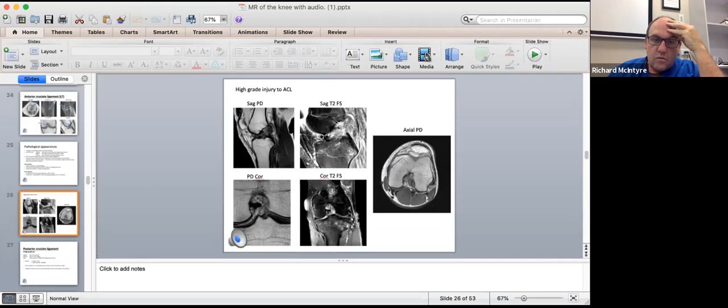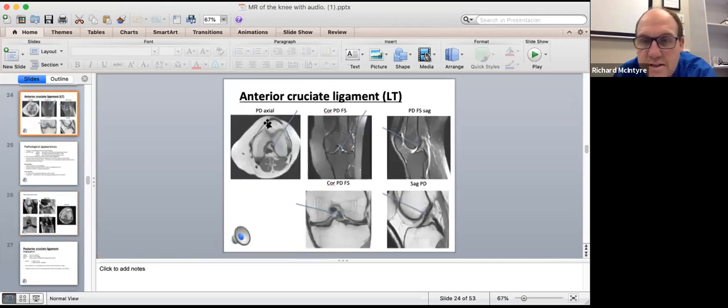We can see maybe proximal ACL, or the ACL attached on the tibial bone there, and it's hypo-intense. However, we lose that hypo-intense signal if we compare it to this one where we've got a hypo-intense signal along the course of the ACL. So that's a nice ACL fibre.